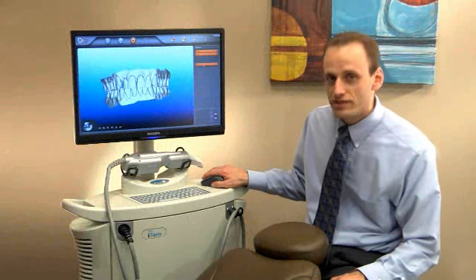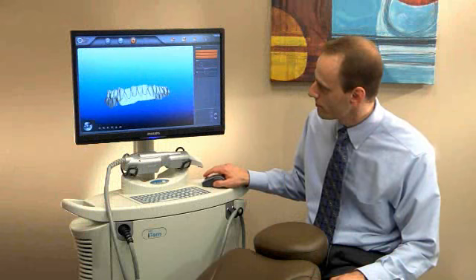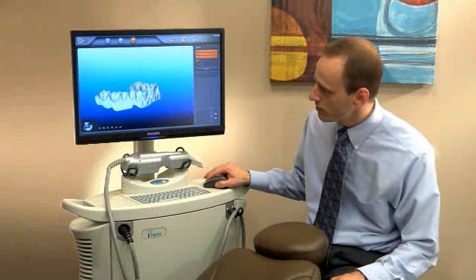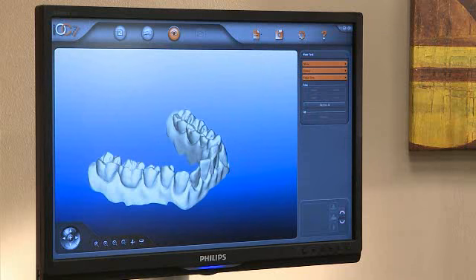The next option is Edge Trim. Simply clicking on the Edge Trim tab allows me to mark a particular area I wish to remove from the model, usually soft tissues or other artifacts. I'll press Mark, press Apply, and the soft tissue is removed from the model. If I remove something accidentally, I can press Restore All to bring that surface back.